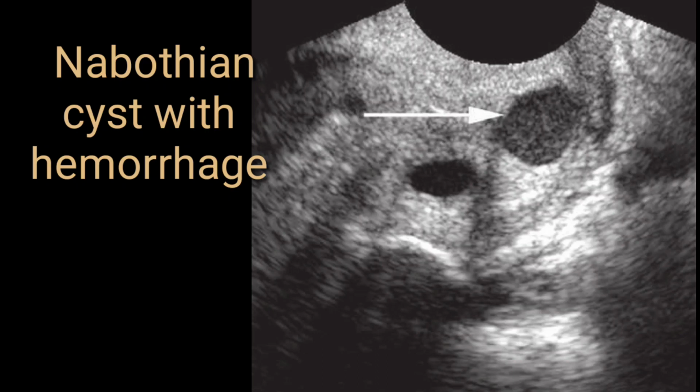It is filled with hemorrhagic contents, so that's why it will be a hemorrhagic cyst. Hemorrhagic cyst happens to be very painful, so definitely this patient will be having severe pain in the cervical area during the examination, per vaginal examination, or during any instrumentation. In any instrumentation, the patient will give you symptoms that there is pain and she cannot tolerate that. So that could have been because of this hemorrhagic cyst.